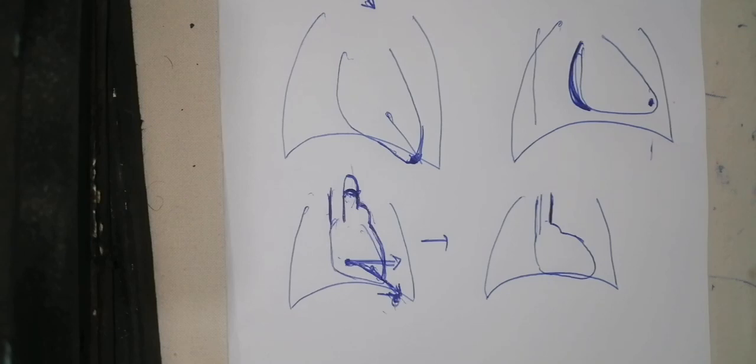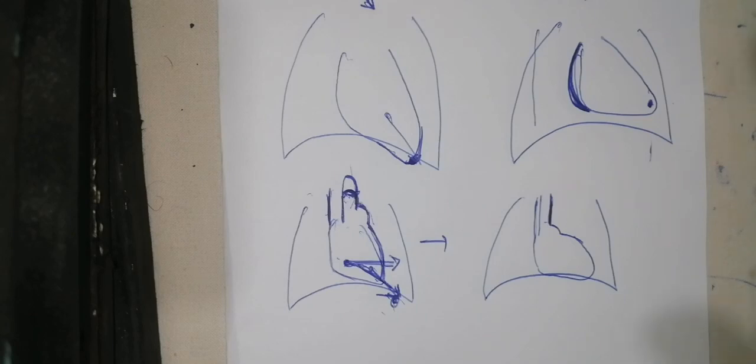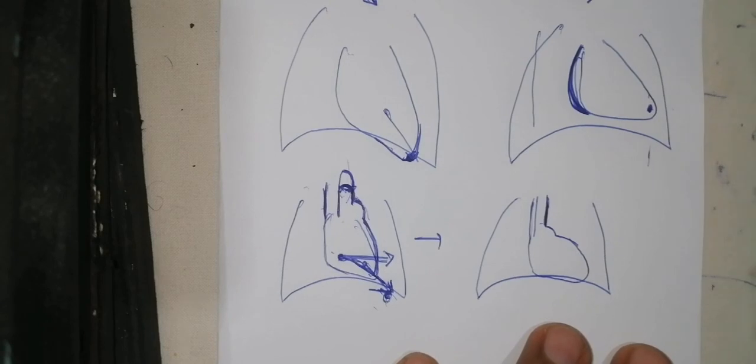So if you have a patient that has a chronic hypertension occurring for a long period of time, more than 6 months, you already know that he's going to have a left ventricular hypertrophy that is going to be shown here. So those are the different things that you must put in mind when you are studying this patient, cardiomegaly and all that.